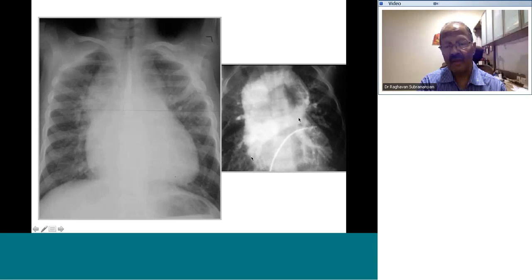And this is the angiogram in the follow-through phase, the pulmonary venous phase. You can see the right pulmonary vein coming and the left pulmonary vein coming here to form a common venous chamber, and then a common vertical vein ascending up into the innominate vein draining into the right superior vena cava. Now you know how the upper half of the snowman is formed. You also know how the lower half of the snowman is formed.